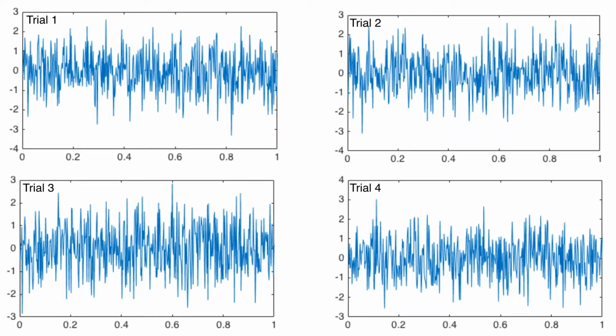In the previous video, we considered the EEG data from condition A recorded from individual trials. Through this visual inspection, we perhaps noted some features, such as the data looks noisy and maybe rhythmic, but it's hard to come up with conclusive or decisive conclusions about these data through this inspection of individual trials.